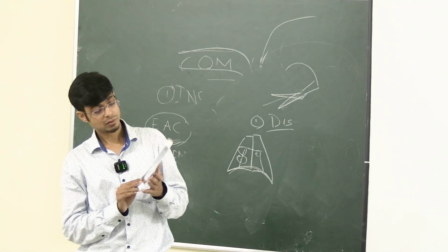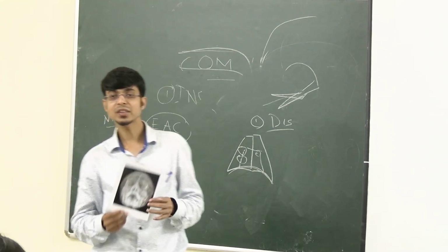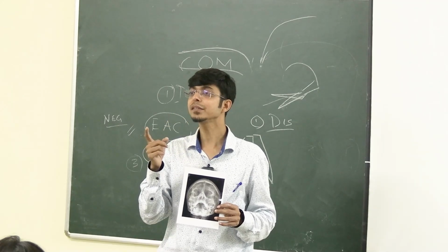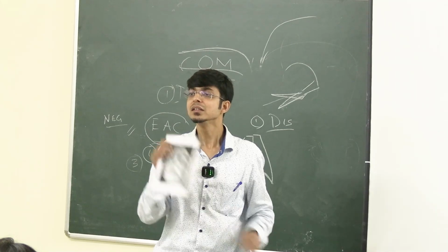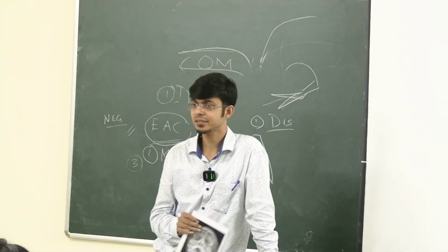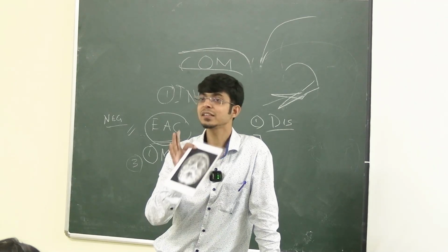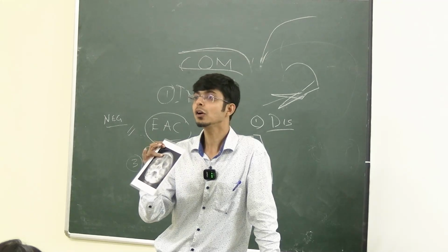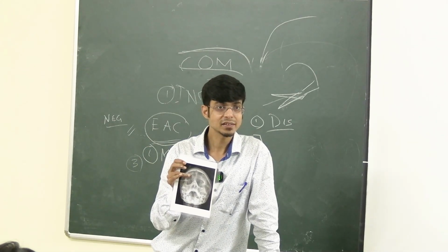So the development of sinuses you will have to read. This is important because the examiner will ask you, many a times it is asked, from the X-ray, what do you think will be the age? So whether frontal sinus is developed or not, pneumatized or not, how the maxillary sinus is pneumatized, all these things.